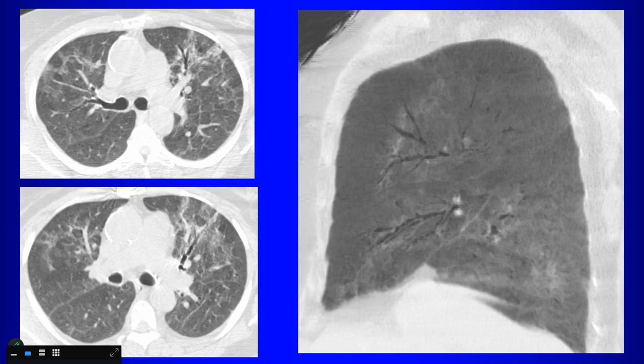Well, what else have I done to bring out the contraction bronchiectasis? Like a MINIP, yeah. This is a MINIP. So you're used to looking at MIPs for looking at vascular work. That's going to show you the densest pixels within any particular slab.